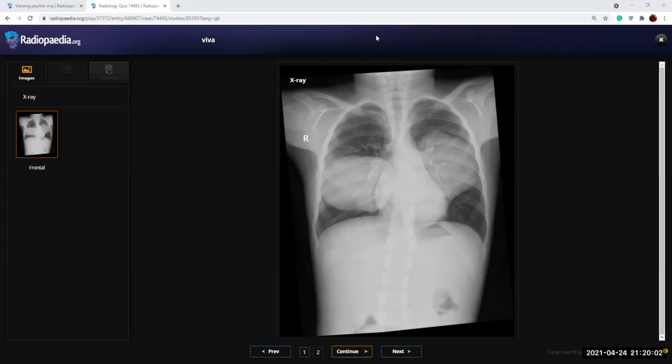Yeah. So where is the origin? Where could be the origin from? If it is an acute margin with the mediastinum, this lesion may be cystic, and it can be. Cystic where? It can be in the. You are right, it is cystic, but where?